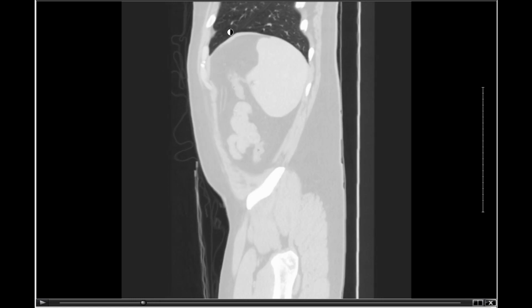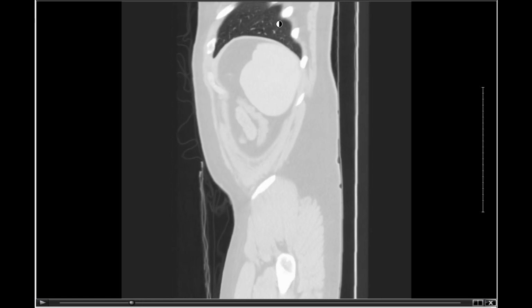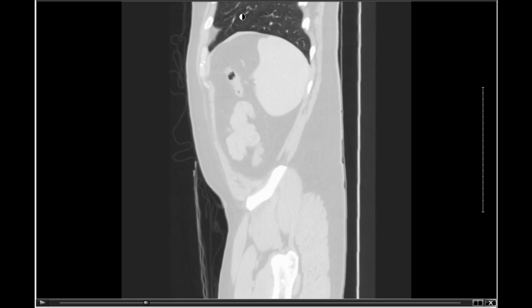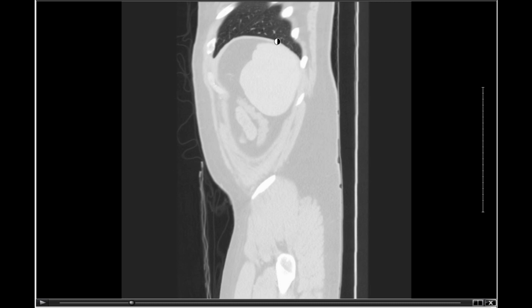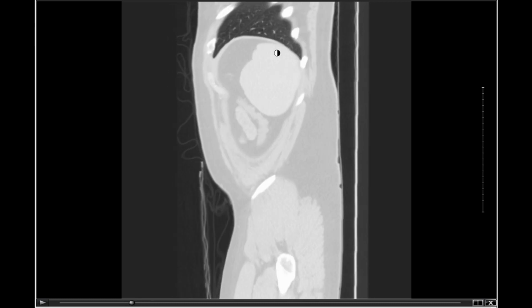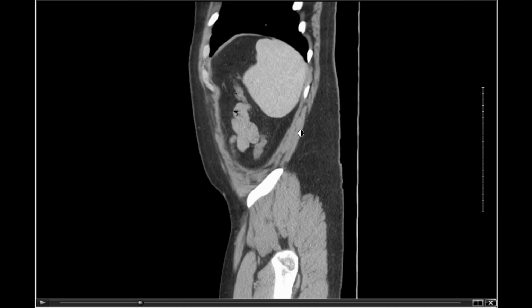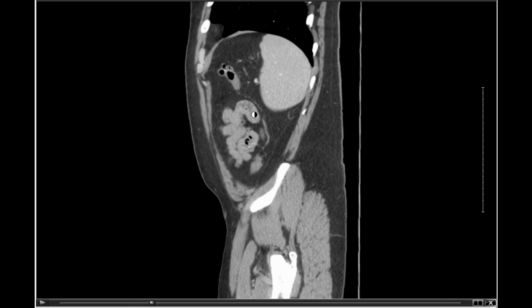I don't have the whole span of it because it's an abdominal CT, but here you can see the markings of my airway and pulmonary vasculature, and you can even make out the oblique cleft, the oblique fissure of my left lung. Okay, so let's get back to the same setting we were at earlier, and here we move a little further deep into the abdomen. A lot more small bowel coming into play right here. We can see those little squiggly vessels traveling as well.